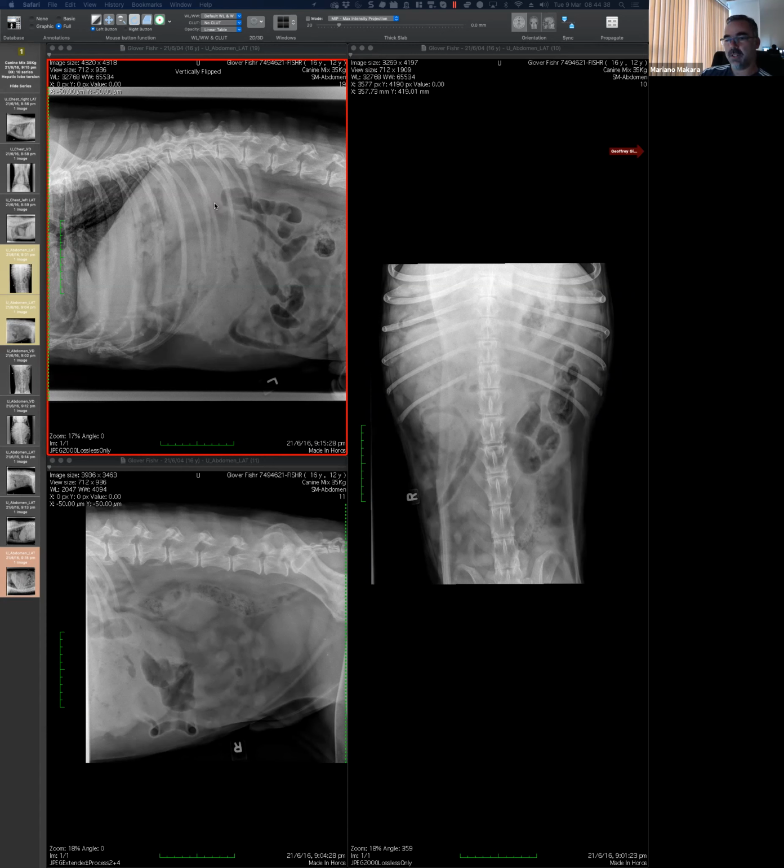And I think there is some degree of fluid. So I think that's why it can explain everything. And again, the presence of the gas, I don't know if it's because it's long-standing and then necrosis, or if it's because of an abnormal blood supply, and then there is an issue with the blood supply resulting in the accumulation of gas. I'm not sure which one is the mechanism.